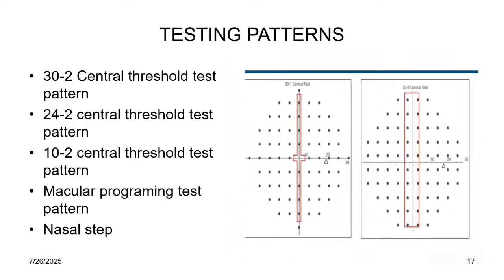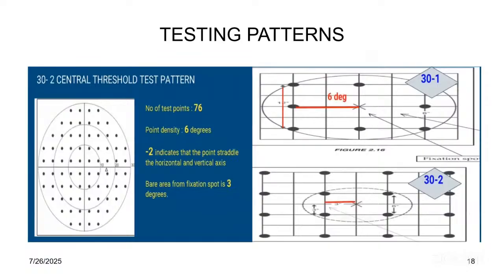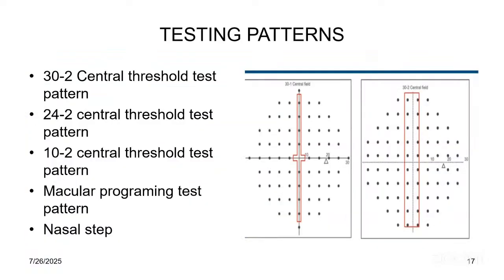So for the testing pattern, the testing pattern indicates the extent to which you are measuring a visual field.